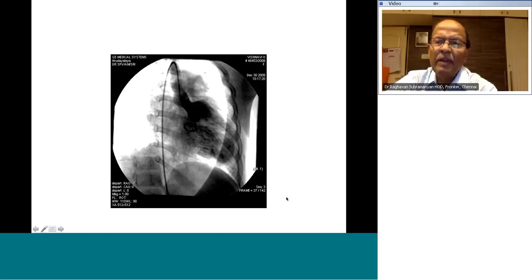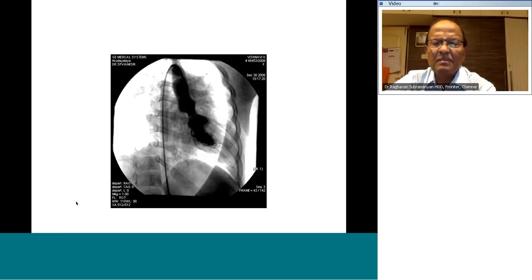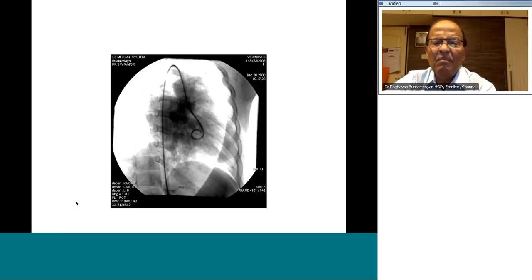Do you want me to run the angio or are you happy with the still frame? Now you have to interpret it. You want me to show the live angio again? I'll run it for you again. There's a lot of information in an angiogram.